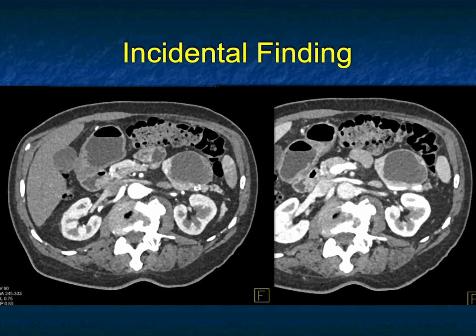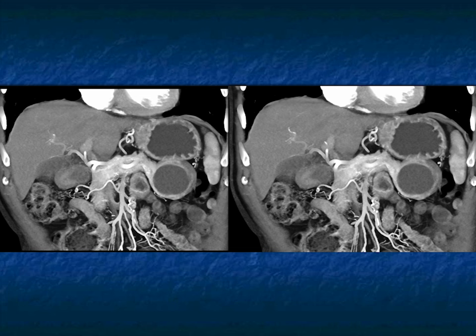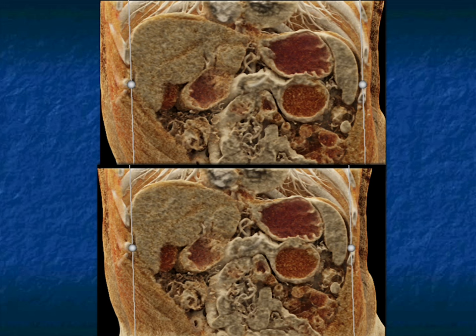The thing is, when you see cystic neuroendocrine tumors, typically the small ones are cystic with rim-like enhancement. This has some rim enhancement and nodularity, so it would be really atypical. But again, when you have to answer the question, you've got to really think about a cystic neuroendocrine tumor. I'm not saying it's the only diagnosis. I gave you a few others. I might have gone with an MCN in this case if I had to pick one thing. But cystic neuroendocrine tumors, beautifully shown here on the volume rendering, that rim enhancement is just so nicely shown. Here it is on the cinematic as well.